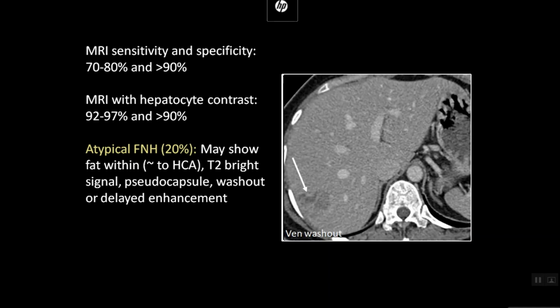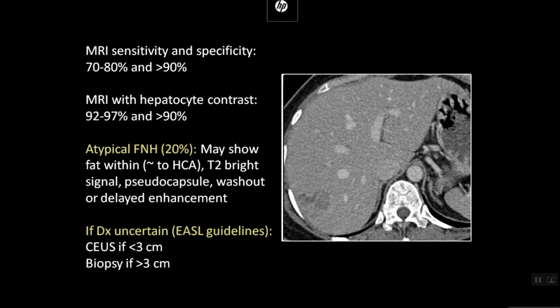Okay, so when I see this on CT, would I recommend a biopsy versus a hepatobiliary MRI? I would recommend a biopsy because there's nothing on this to make me think of FNH, and the washout makes me a little worried. Adenoma, of course, can still be an adenoma, but I think this was not that classic age group, right? So we biopsied this one. This was an FNH.